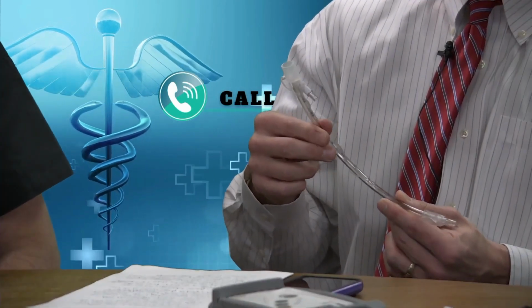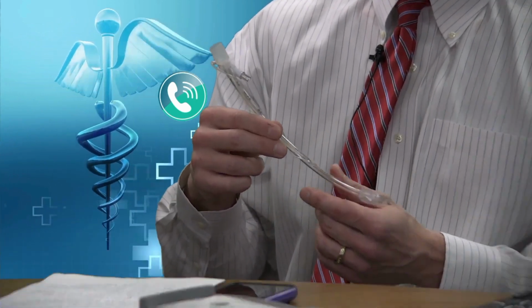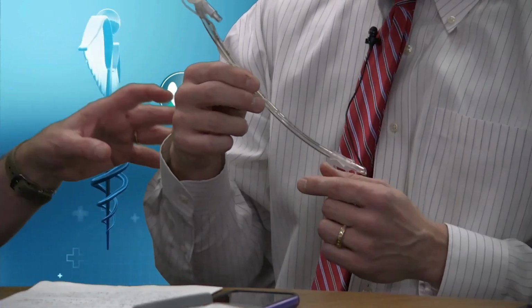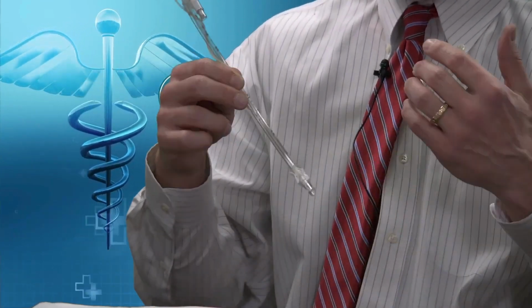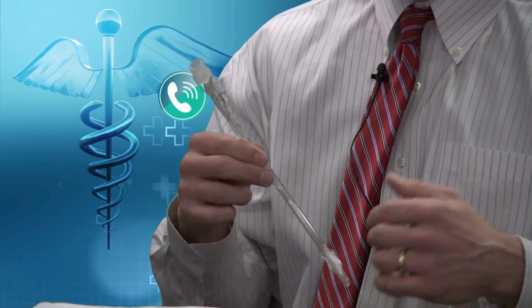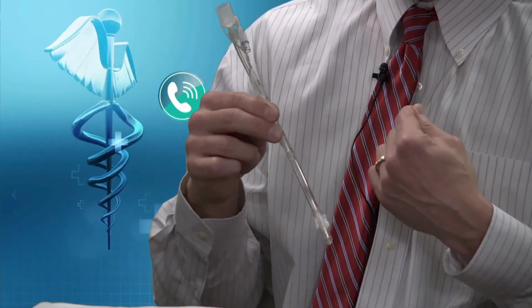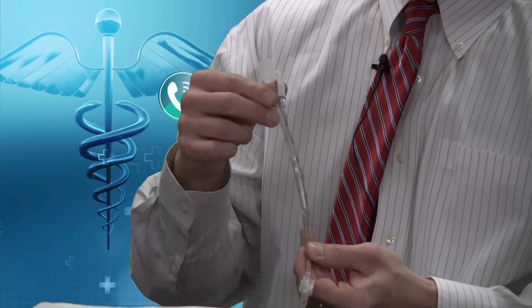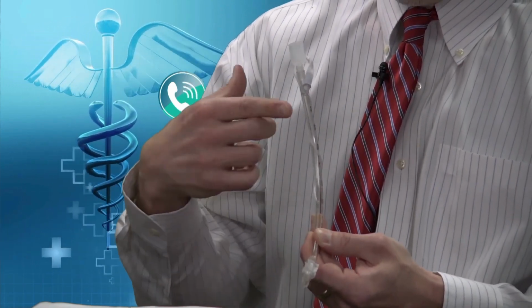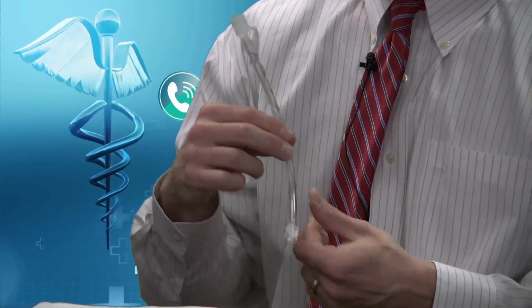There it is. So it's a plastic tube that once the patient is unconscious and unaware of anything in the operating room, that's done by medicines that come through their IV. Right. Medications are administered IV that make the patient unconscious and unaware. This tube is inserted into the airway, the windpipe, trachea, and we deliver oxygen and anesthesia gas through this tube to keep the patient asleep when we're doing general anesthesia.